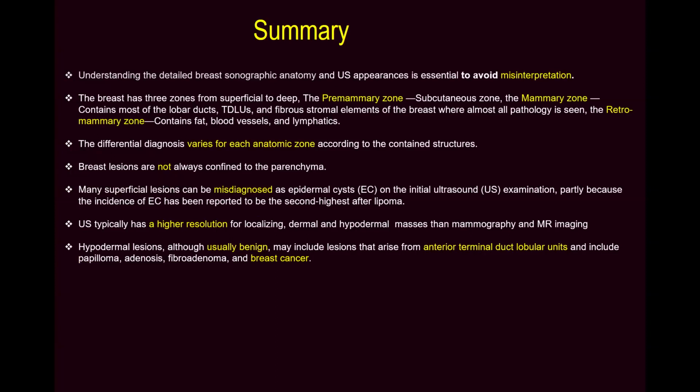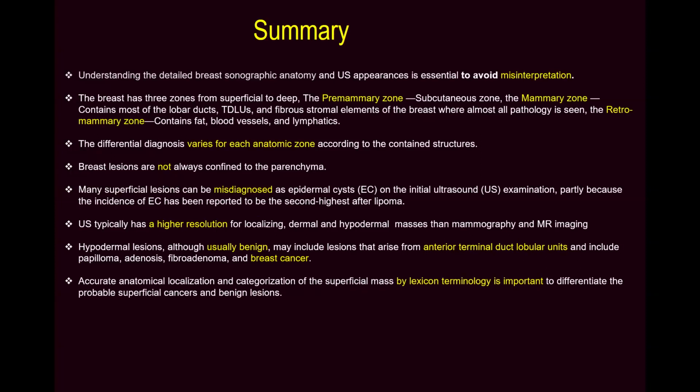And hypodermal lesions, although usually benign, may include lesions arising from the anterior TDLUs, including breast cancer.